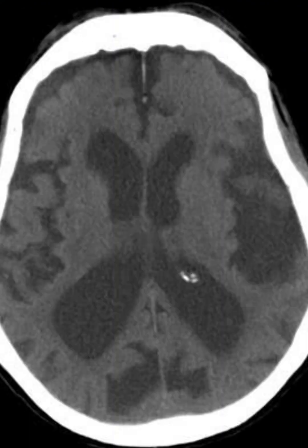Then this is the CT scan of cerebral atrophy, where the ventricles are prominent, and the black wavy lines are actually the sulci and gyri. In a brain of cerebral atrophy, the ventricles are prominent, but if the sulci and gyri are also prominent, like in this CT scan, then this is not hydrocephalus, this is atrophy.